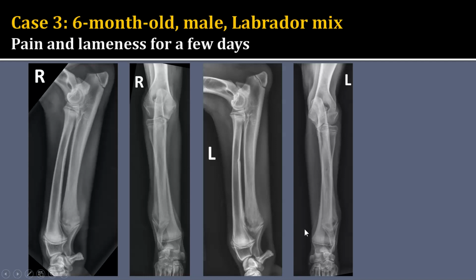So in this patient, this age, and in this location with this appearance, really my primary differential is going to be hypertrophic osteodystrophy, or HOD. Remember that we said there was a possibility that hematogenous bacterial infection could spread like this, but this is really classic for HOD, and this is the right patient, right signalment. So that would be my primary differential.